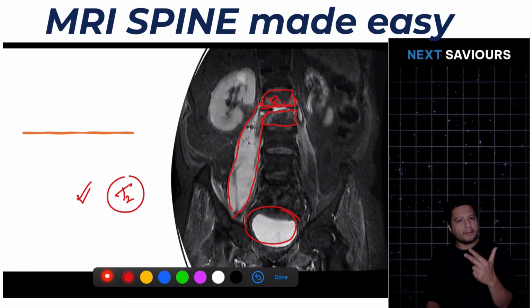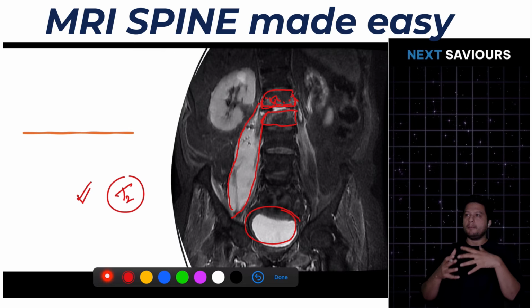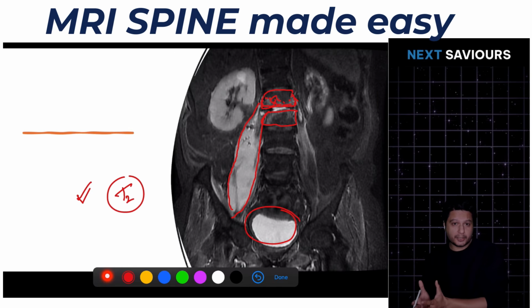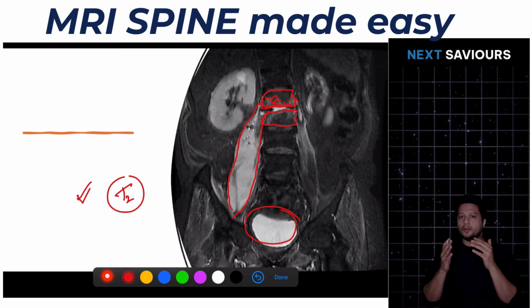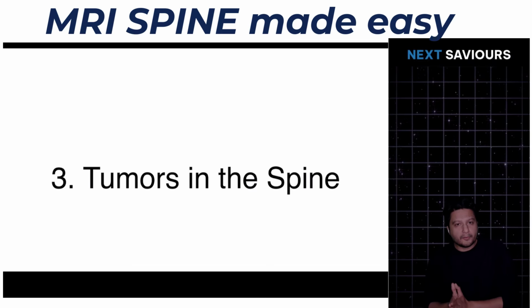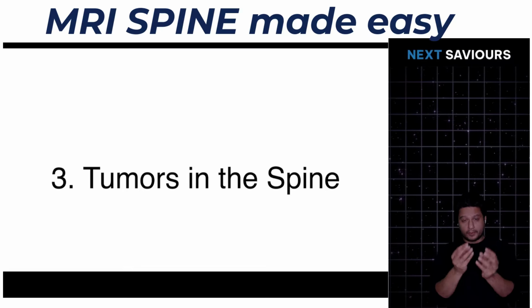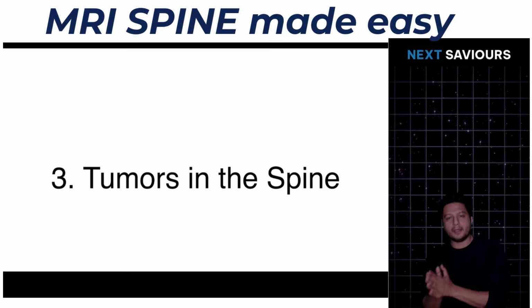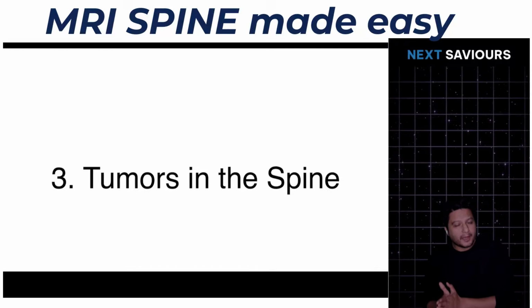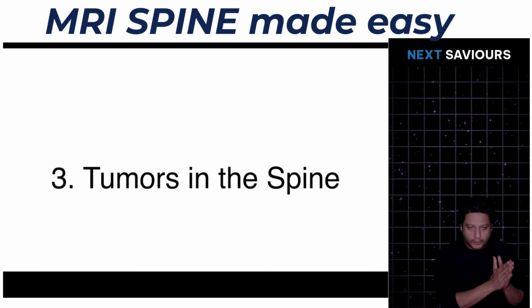So these are the only two images that you are likely to get for infective spondylodiscitis, because Pott's spine is such a common condition the patients are suffering from today in our country. So by this time, you probably have identified how you will mark the answers related to herniation of the disc, if at all projected in the form of the MRI, and also how you will identify the tuberculosis of the spine, if at all the MRI images are provided to you.